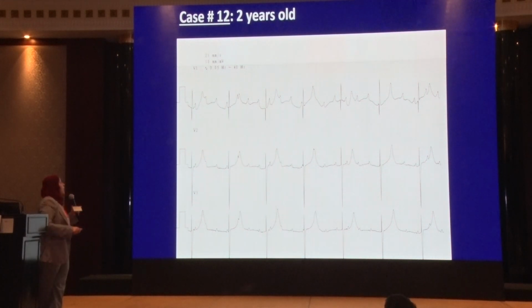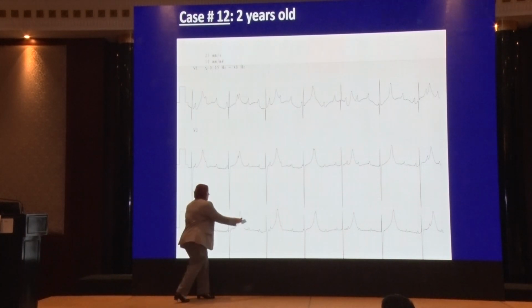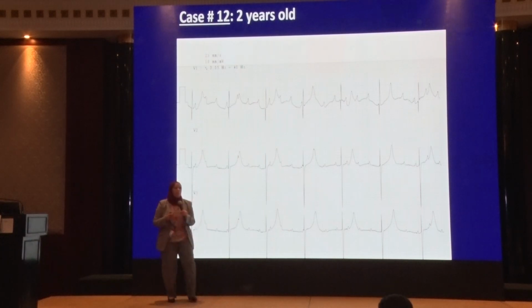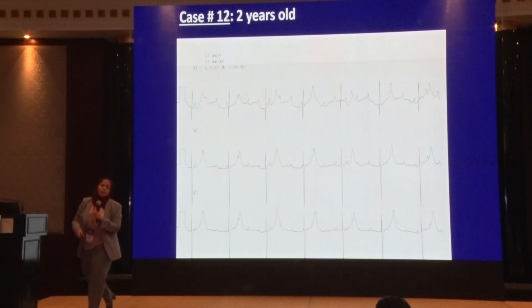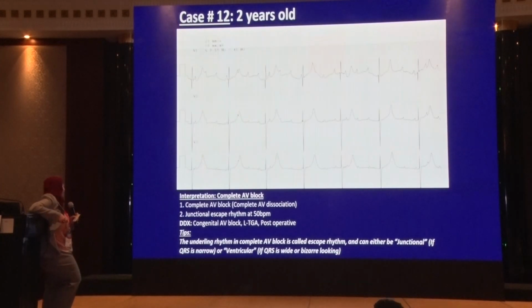What is the most striking thing when we look at this ECG? Bradycardia and what? Bradycardia and very big T waves. Usually we see these very big T waves in cases with metabolic problems. So this patient also, what do we have else?